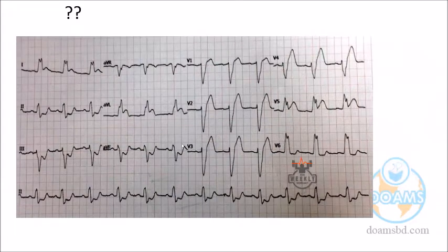Next ECG. Please look at it and get ready to give the answer. Ankit is ready. New participant to give the answer.